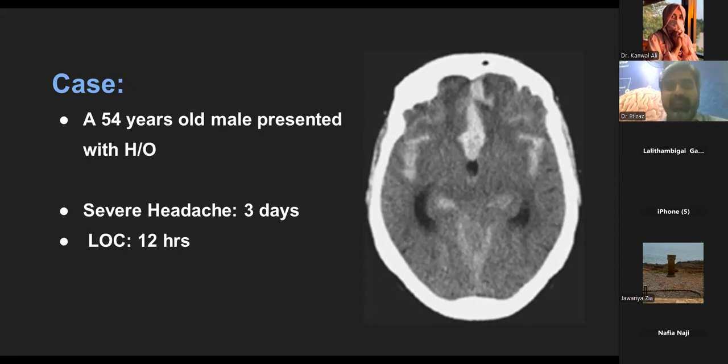Okay, excellent. But be precise and to the point, especially from the exam point of view. Say that multiple hyperdensities are there, most pronounced in the territory of the anterior circulation, most likely the ACOM, and then the bilateral sylvian fissure, with associated dilatation of the ventricles.